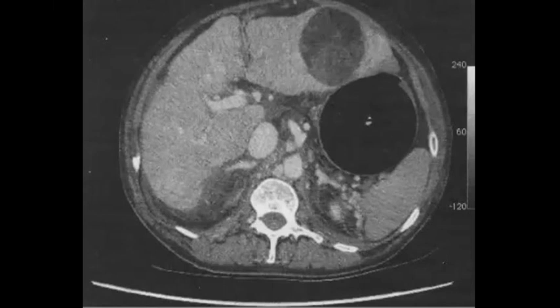But alcoholism is one of them, so you can think about it. I know it's not a typical case, but you have rules. With liver cirrhosis, HCC will be the best and typical differential diagnosis until proved otherwise. Fatty changes can happen, as Nermeen told us, in 30% of cases. So we have this type of HCC.